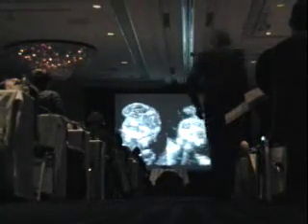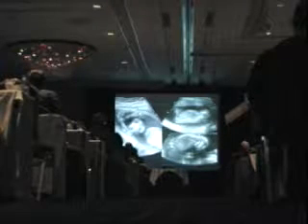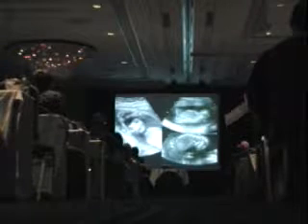And a lot of times early on you will see some brain like that, and eventually this will autolyze in the amniotic fluid and become the classic form of anencephaly, which we see later, where the brain really disappears completely, and all you have is the bony orbits and the back of the head as the uppermost portion of this fetus's head. Now, because the fetus is missing practically its entire brain, it will move in a jerky fashion.